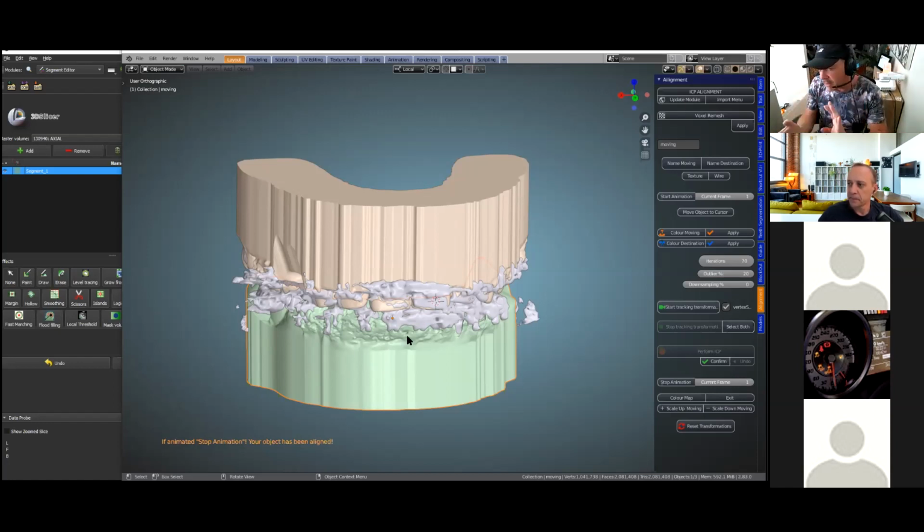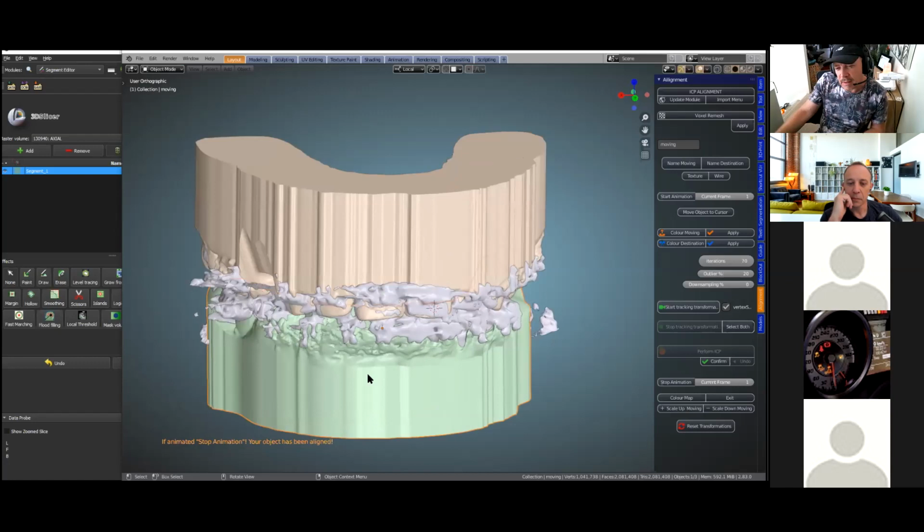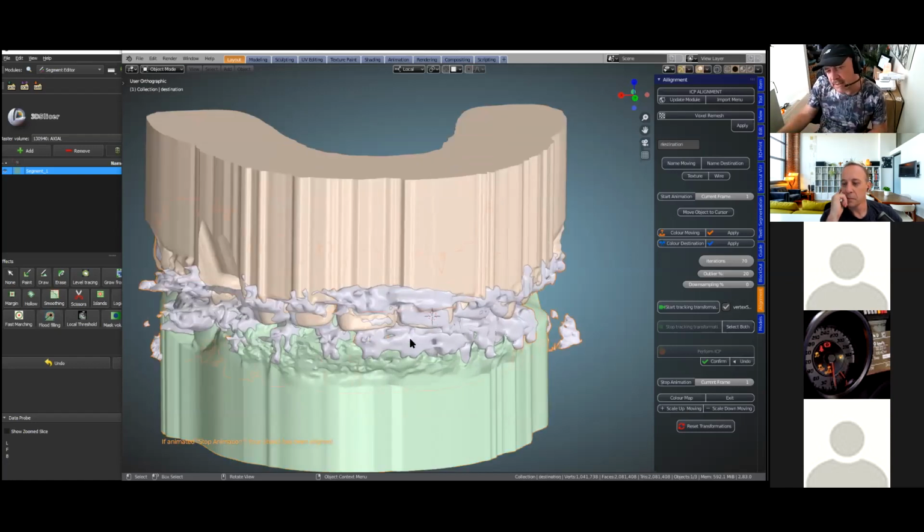So we've done the first step. The next step, we need to put teeth in the gap so that we can see where the implants are going to come out. And one word of advice is get rid of everything that you don't need in Blender anymore, because I've seen a few users carry on with this dense ICP model in the scene. As I've said to you before, it clogs up the procedure. So when we do implant planning, the only thing that gets ported across are the implant components and nothing else.